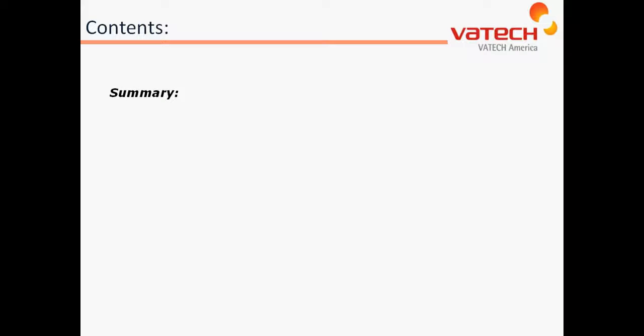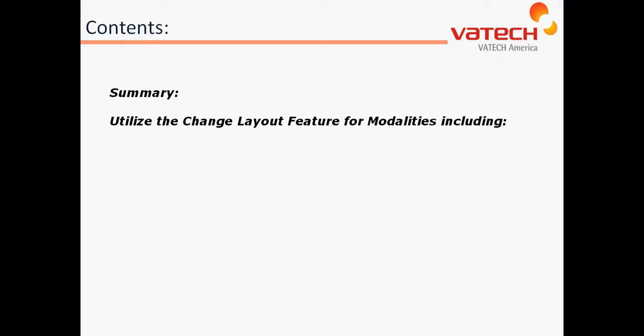This concludes our video tutorial on changing format. You should now be able to utilize the Change Layout feature for modalities including panorama, cephalometric, intraoral sensor, as well as intraoral camera. Thank you.